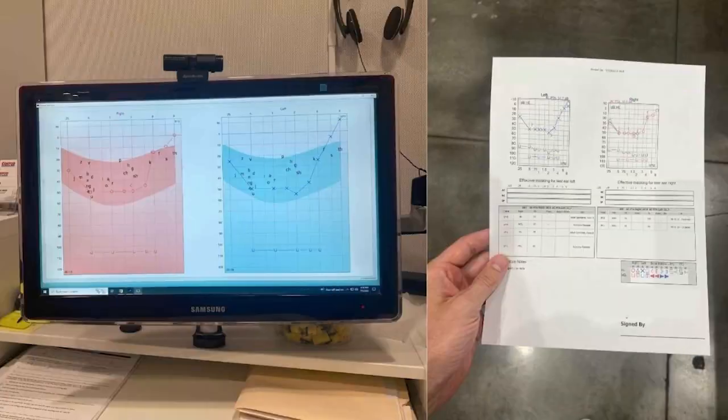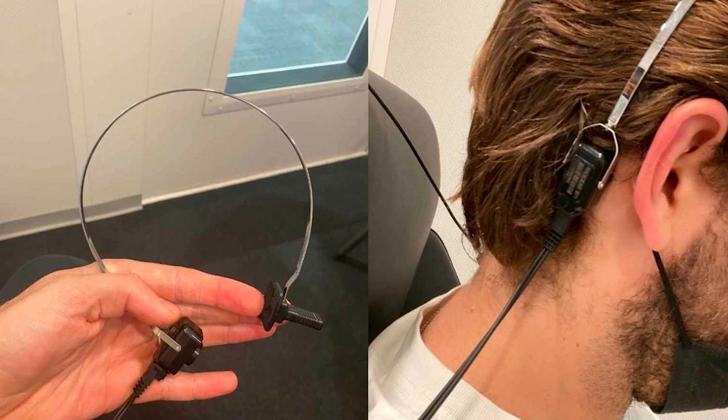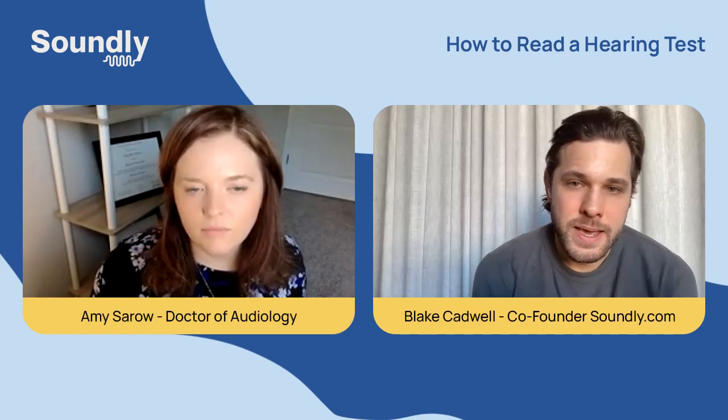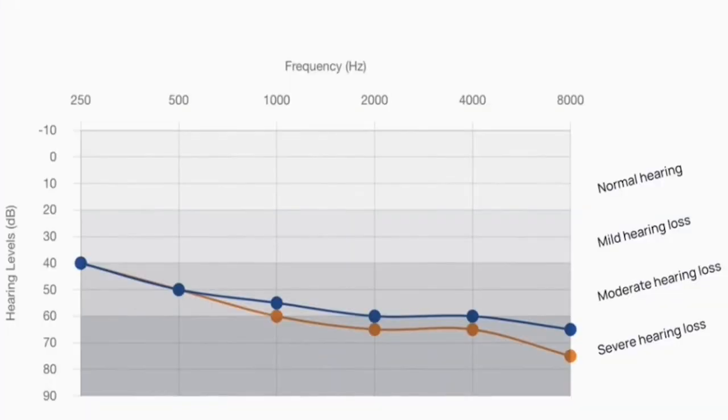So if you go to a local clinic and take a hearing test, you have a whole battery of tests run on your hearing health and your ears, including a tympanogram. You might have a bone conduction test. You might have a speech test. But today we're really going to focus on the hearing chart portion of a hearing test. How do you read that hearing chart?